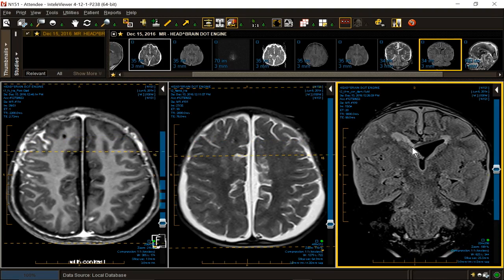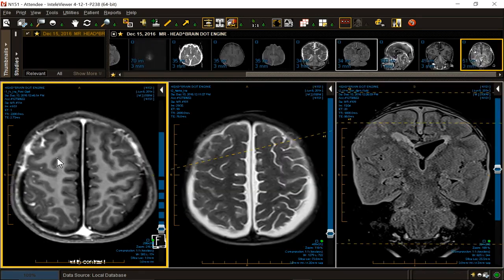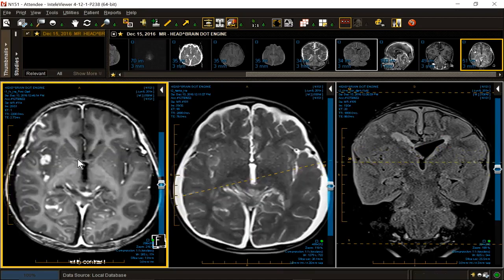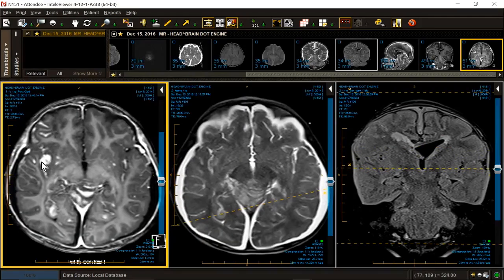So pachymeningeal and leptomeningeal abnormalities, same patient. Multiple areas, though, are a bit thicker. For instance, that's too thick. That's not simple leptomeningitis. That's not simple smooth pachymeningitis. It's too bumpy. It's too mass-like, which means that our lesion has disseminated.